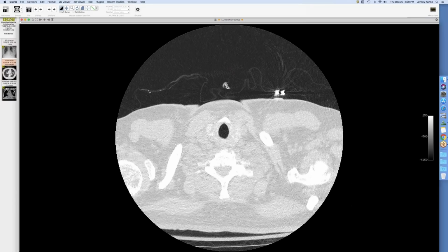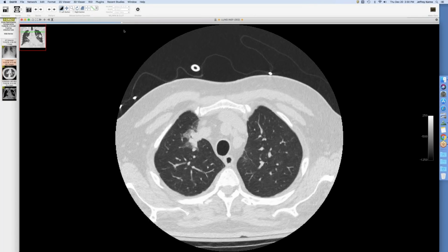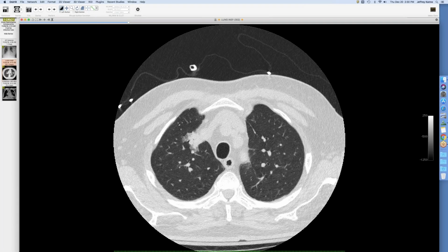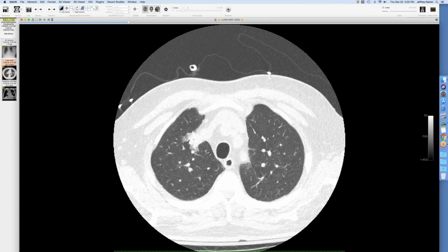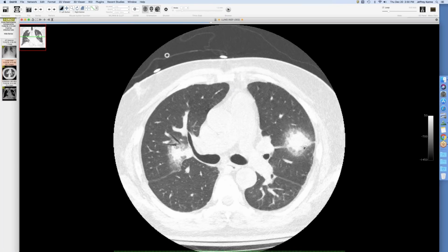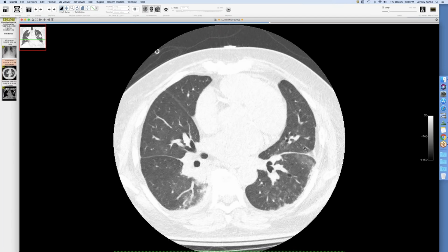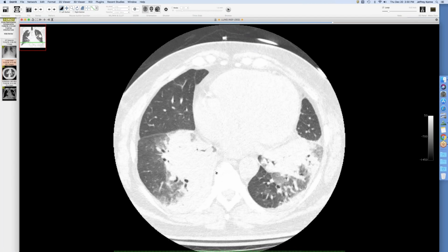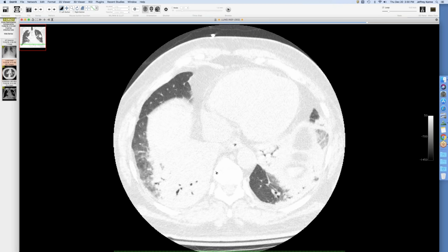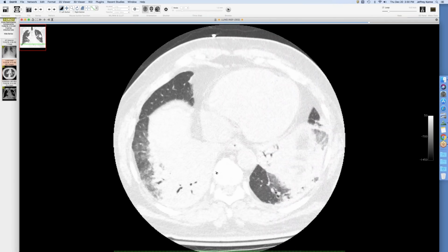But when you look at the CT scan, which was done a few days before, this is a totally different appearance. And this is Legionella pneumophila. This is not one of the other species that we've seen, but it's a nodule with a halo sign. So when you look at this, it'd be a great example for angioinvasive fungus, maybe Nocardia. And he's got denser consolidation down here, which, if he aspirated, or I'm guessing it's all related to Legionella.